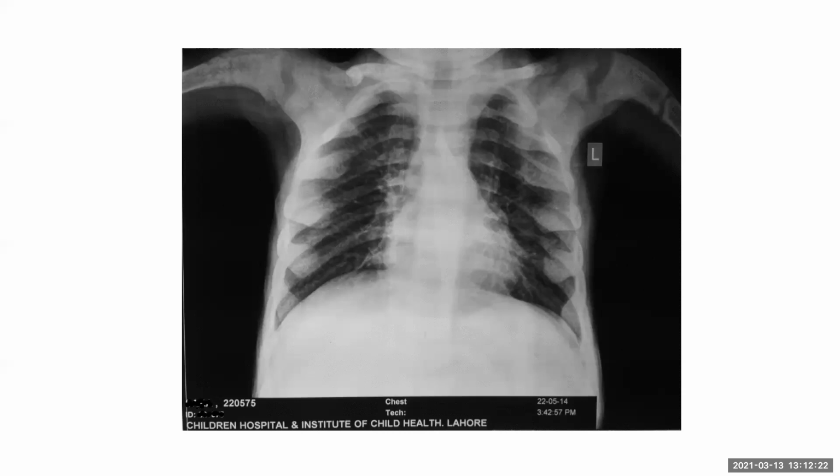And in a patient with recurrent chest infection, I'm looking at the lungs. I can see the lungs are almost clear.